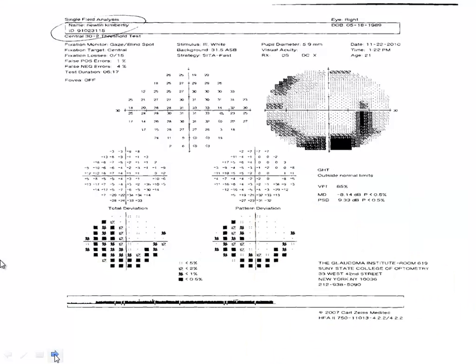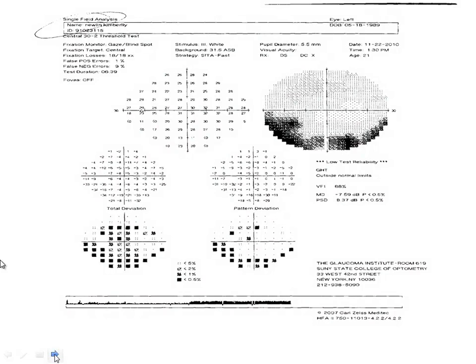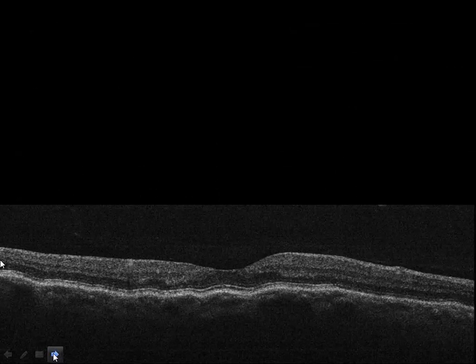They're actually hypo-reflective. And by the way, we talked about the retinal nerve fiber layer being thin superiorly. That's why we have this inferior field loss in both eyes. And ultrasound does show it, again, with ultrasound we're getting an increased echo, which is exactly opposite of what we get with OCT. So that's important to keep in mind.